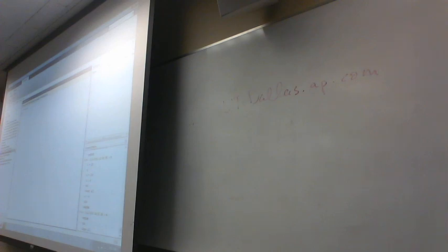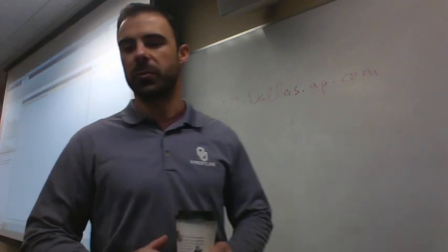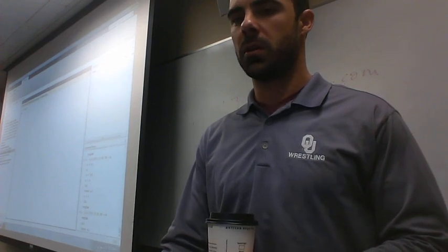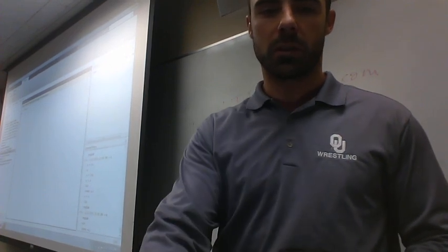So we can work on shortcuts later. We got this idea of shortcuts, we can get to that, and we'll do a couple other little tricks as we move along. So, a little basic intro and overview there for some MATLAB programming.